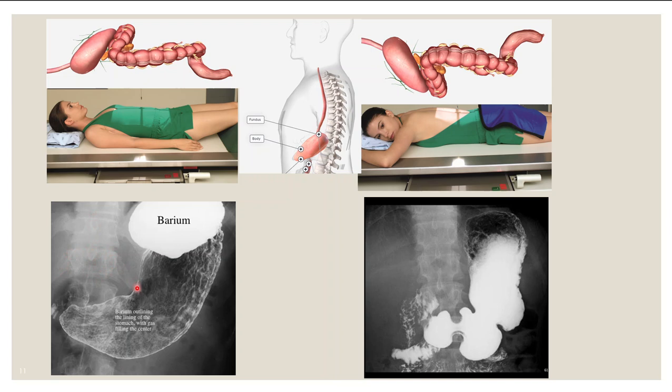We can also see the ribs coming off of the vertebral bodies laterally, and those are pretty much equidistant. They're symmetrical. There are the right and left pedicles here on the vertebral body. Those should be equidistant from the lateral borders of the vertebral body and symmetrical. And those spinous processes down the center. So we can go to the next x-ray here and do the same thing.